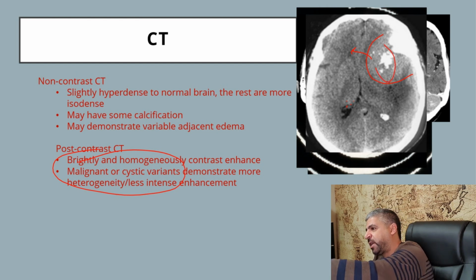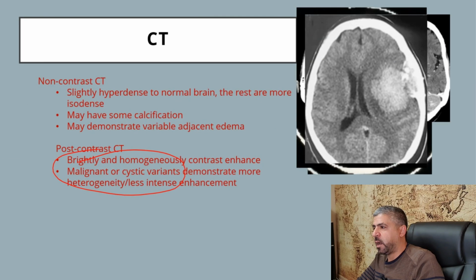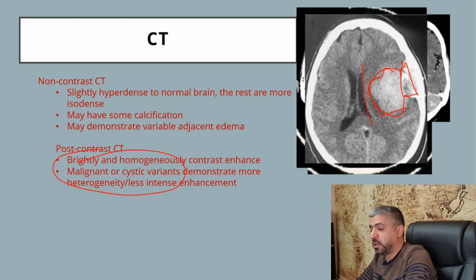It contains calcification with underlying hyperostosis of the skull. And another example you can see here, this meningioma has an irregular outline. There is underlying hyperostosis. It's multilobulated and bulging into the brain, causing some mass effect. And this is suspicious for possible malignant transformation.